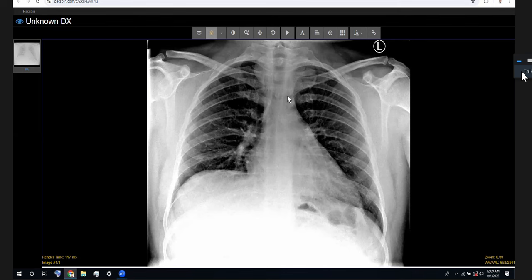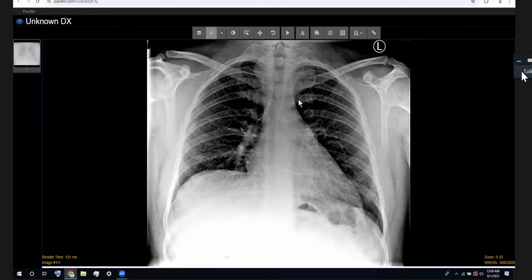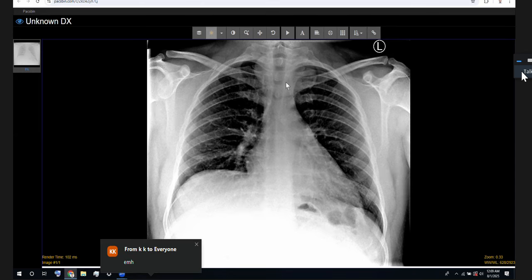Remember, this is a youngish chap, and he had a chest X-ray about 6 months ago that was completely normal. So the differentials I can consider are a thyroid lesion, possibly, and paravertebral neurogenic lesions like schwannoma, possibly. And also a neuroenteric cyst or meningocele, maybe. Okay, here's the CT.